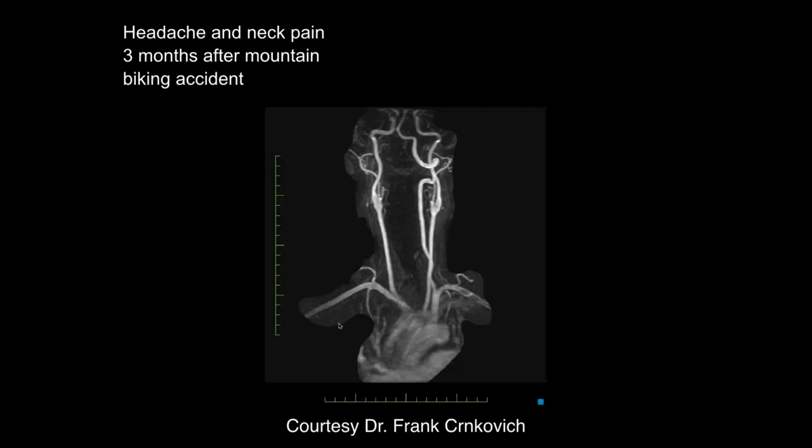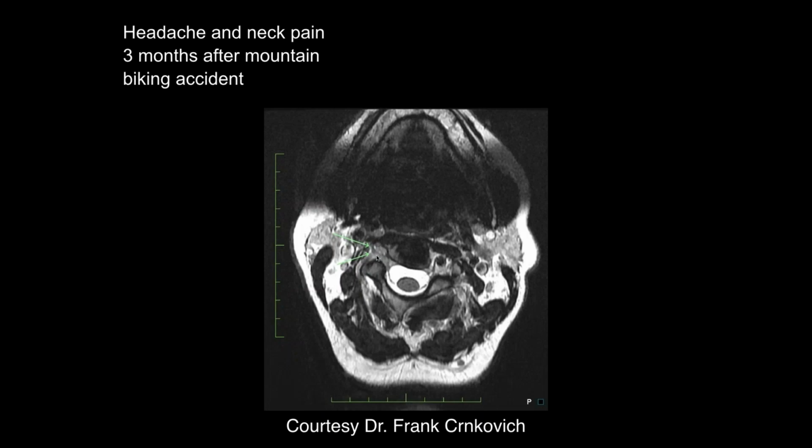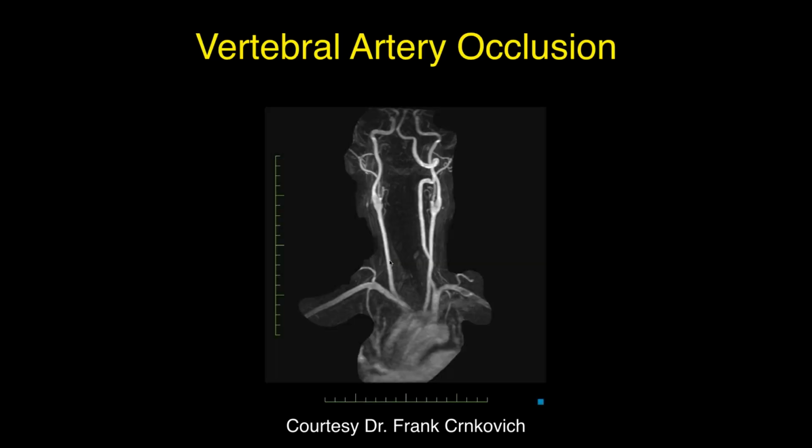Dissection or something. Here is the angiogram. So on this side we have this vessel. The other side is gone. I see a dissection. And if we go here, these are the vertebral arteries, and they're right through the foramina there. We can see nice flow on one side, but not the other side. So it's vertebral artery dissection. So it's really an occlusion of the artery, associated with dissection. So easy to miss.